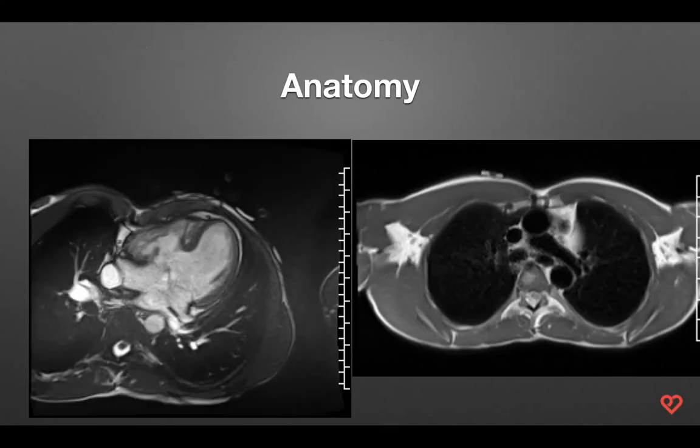I'm going to point your eyes to the picture on the right first, and what I want you to notice is that the aorta is anterior in this individual compared to the PA. This is the malposition that we're talking about. Generally, in normal hearts, the PA is anterior to the aorta. So this is once again the aorta, ascending and descending.